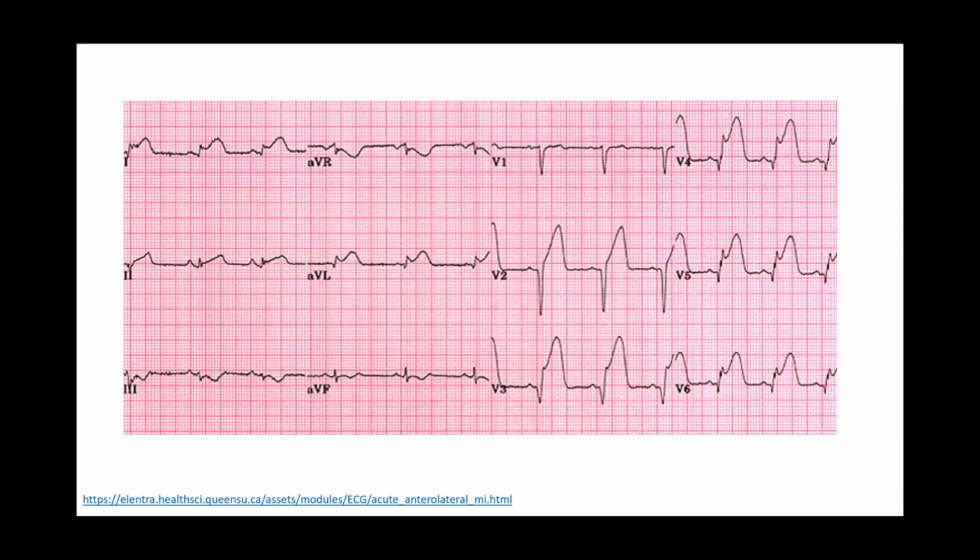Pause the video and give this one a try. Okay, I'll be a lot quicker with this one since we got a lot of practice already. I do see ST elevations in 1, AVL, and everywhere from V2 down to V6.